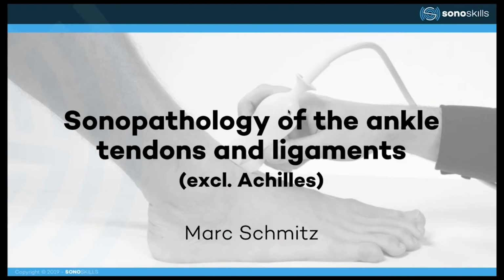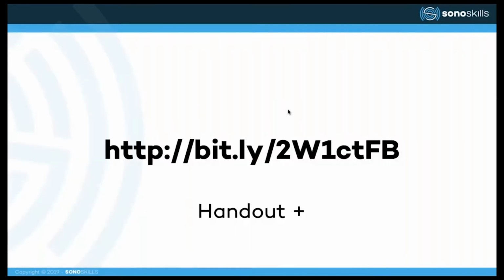And today we're going to speak about sonopathology of the ankle tendons and the ligaments. We won't be discussing the Achilles tendon, because that's a topic which is being discussed a lot. I just want to focus on some other structures in the ankle and foot region.